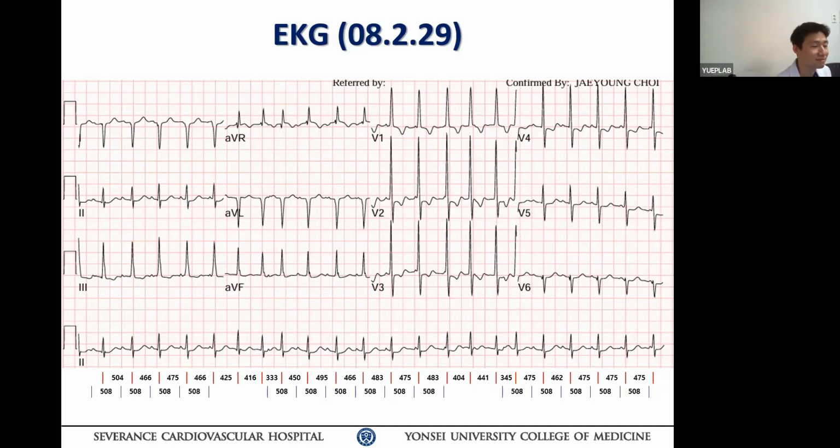If you look at the narrow QRS complex tachycardia carefully, the QRS morphology changes a little by little, especially when there is irregularity. So even JT, junctional rhythm, shows a narrow QRS complex very similar to the AV node conducted QRS, but if the focus is an automaticity mechanism, it is a little different. Okay, so Dr. Oyundari, please finalize.